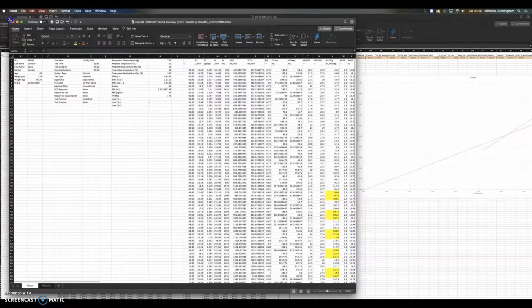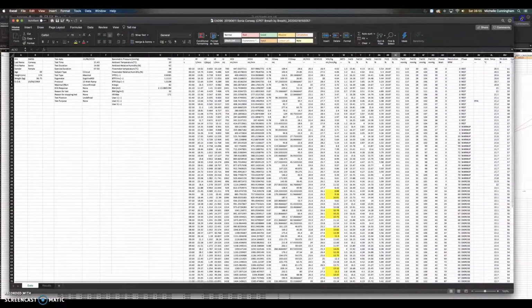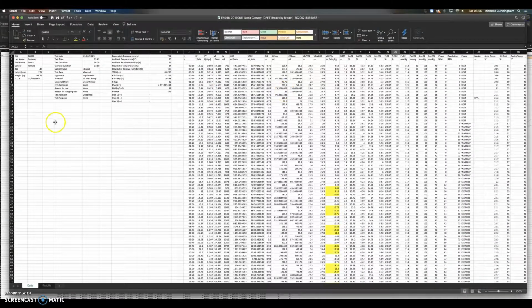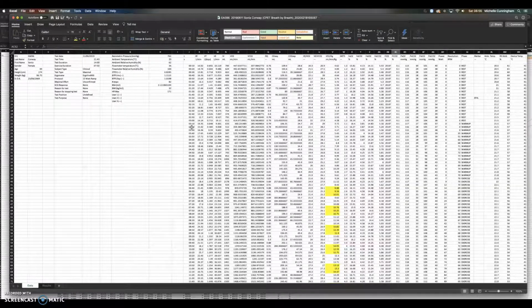So this is the data file. Before you paste it in, you're going to paste all this data into the first sheet on the data processing file I gave you. The things I want you to look at here are, in some of the files, just the way the data was extracted, there are a few additional columns of data here, and if they go into the other sheet, it messes everything up. So you need to be careful of that first. There are 3 columns in particular I need you to pay attention to, and I'll send you a photo of the ones you need to be careful of because they mess up everything.